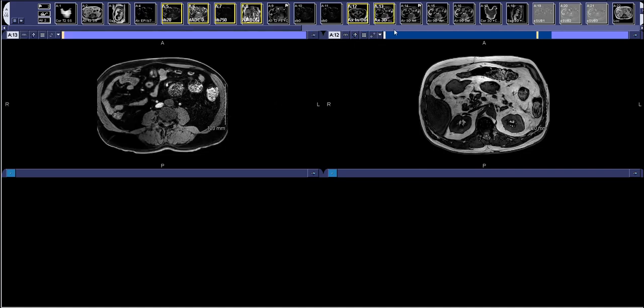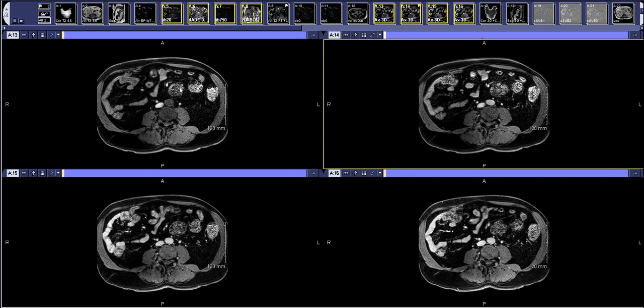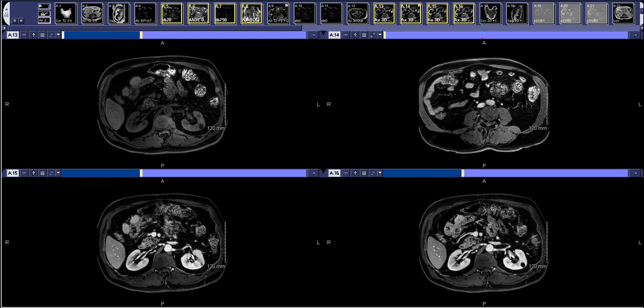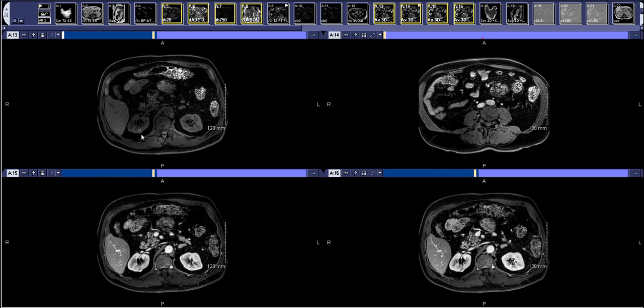So we're almost to the end. Next, I'll look at our post-contrast images. So actually this would maybe be a smart way to start the exam, to look at our T1 pre-contrast. If you see anything bright on our T1 pre-contrast, you'll probably want to use subtractions. So at this point I can see that the lesion in question does have inherent T1 hyperintense signal.